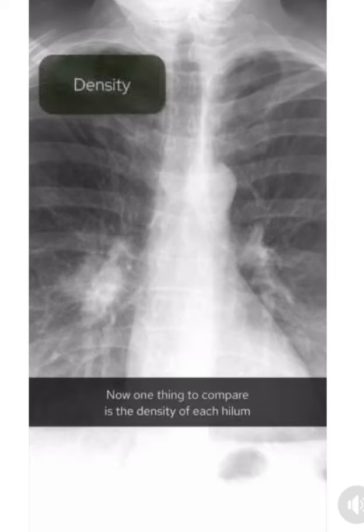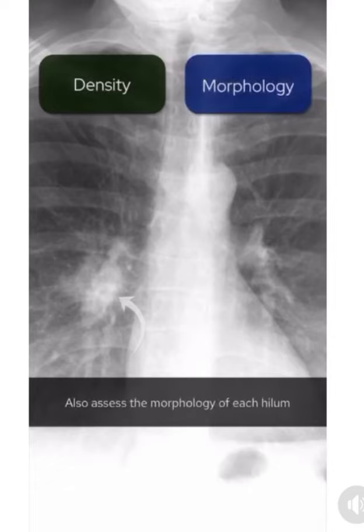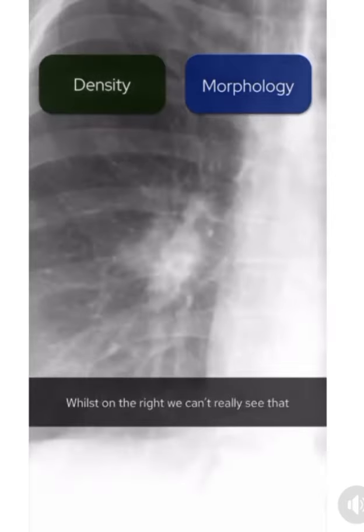Now one thing to compare is the density of each hilum. If we compare the right to the left, we can see the right is more dense. But don't stop there, also assess the morphology of each hilum. On the left, we can see tapering branching vessels. Whilst on the right, we can't really see that.